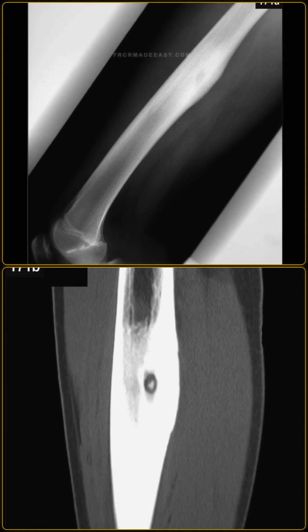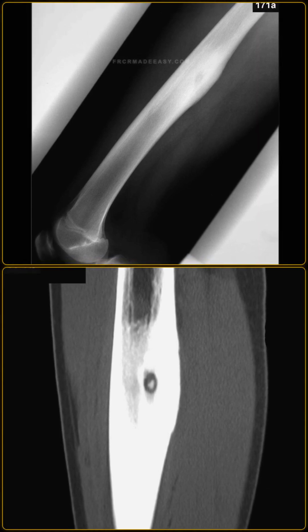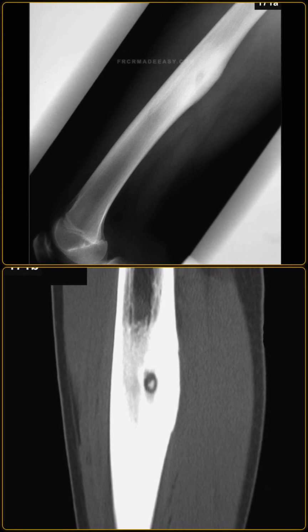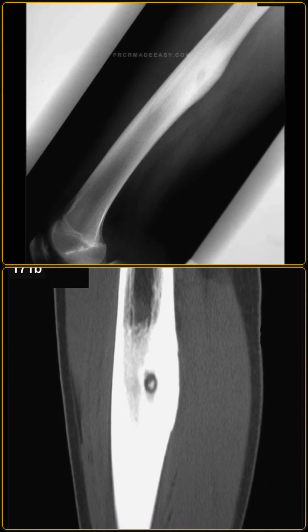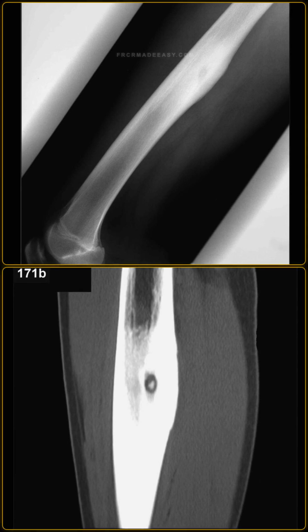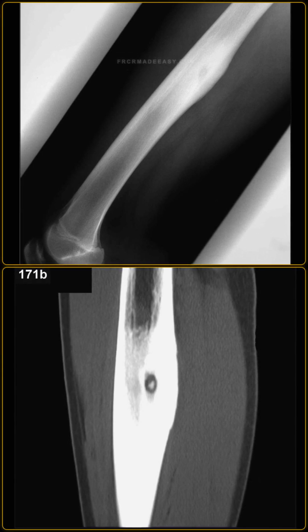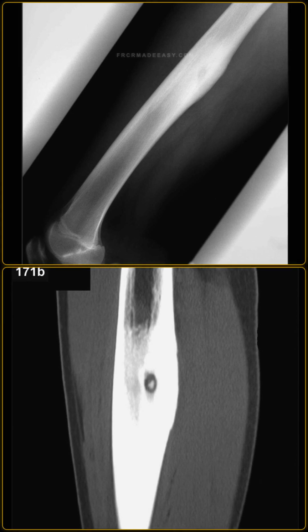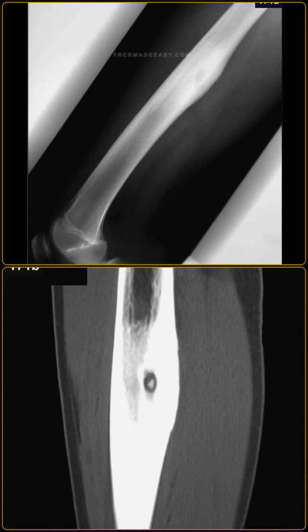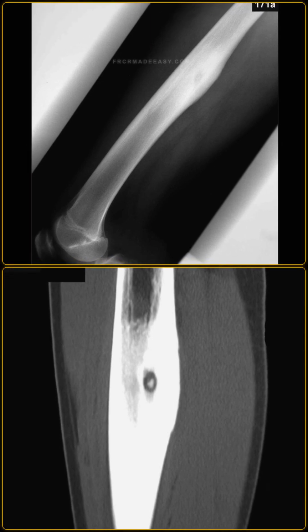shaft. Computed tomography is the imaging modality of choice for osteoid osteoma, as it easily identifies and localizes the nidus, which may be obscured by the dense surrounding sclerosis on plain films. CT confirms that the nidus is well-defined and may contain a small central calcification, allowing for a confident diagnostic distinction from infection. Discuss the different types of osteoid osteomas based on location, and detail the scintigraphic appearance.